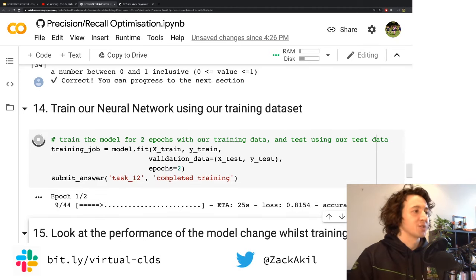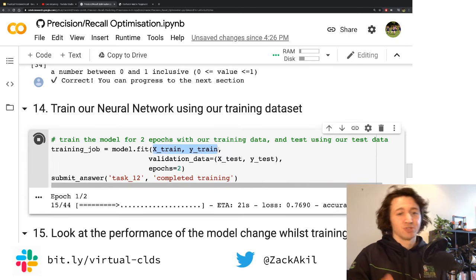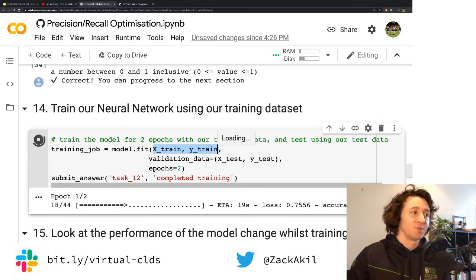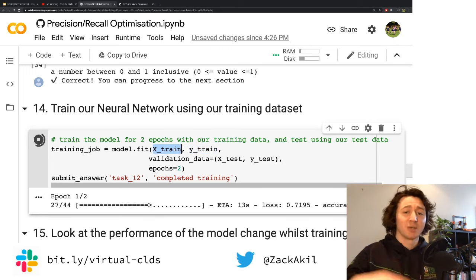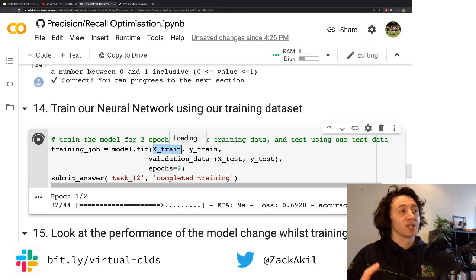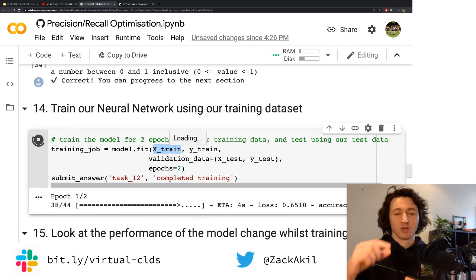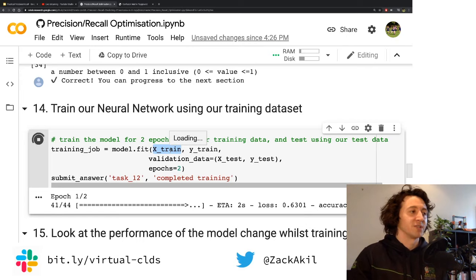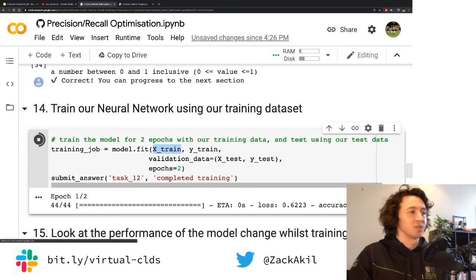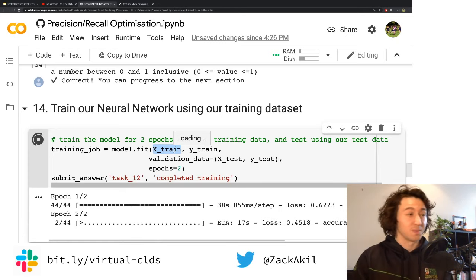It's going to be using our training data to do what I said at the start, what supervised learning is doing. It's all about finding the pattern between our training data and our output data. Remember, we ran that function that would split our x and our y, and this was the output of that function. So it gave me an x train, a y train, and an x test and a y test, which are all splits of our data. So it's just gonna look at the x train and the y train when it's actually trying to learn the problem.